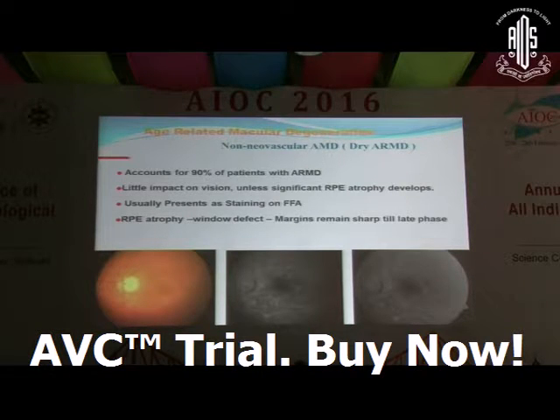Both staining and leak are hyperfluorescent, but the important thing is how to distinguish between staining and leak. You have to have an early photograph and a late photograph. If you compare the early to the late photograph, the margins of these lesions will remain the same from early to late, and that's why we say in these patients there is staining. If these lesions leak, then we say it's an active hyperfluorescence, which depicts classical CNVM, that is choroidal neovascular membrane.